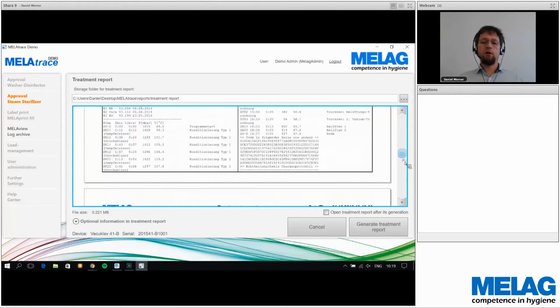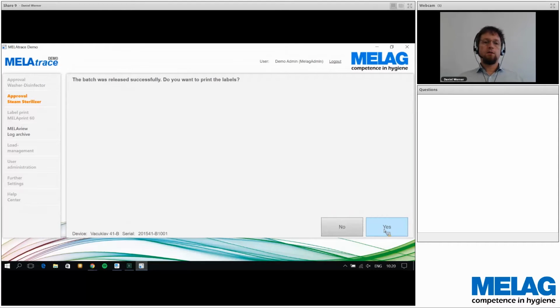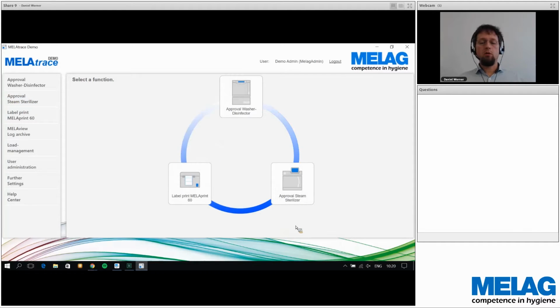And in the last step I get a question, labels, yes or no, and I can click here on yes. I can select the number from my labels, maybe just one, and then I can say print. That's it. That's the small way from the MELAtrace. Okay, now you know the extended way and the normal way.